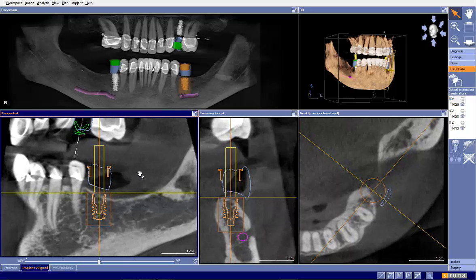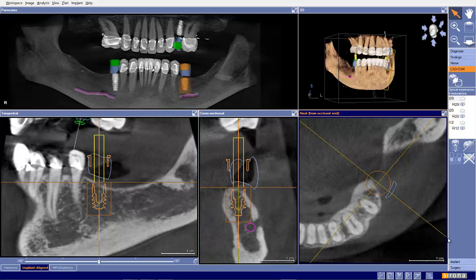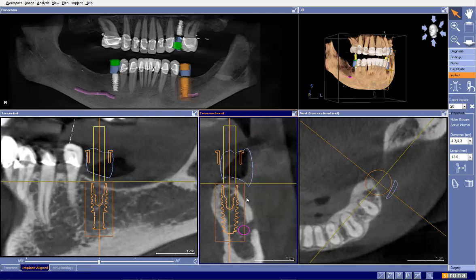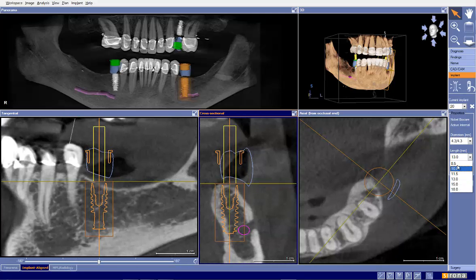So now my initial reaction to this is that in a premolar site, we typically want to start with a 4x13. So obviously, in this particular case, that is definitely not going to work. So I can see why we went to a 4x8.5. Now that's a relatively small implant. I would like to see if we can go to a 4x10.